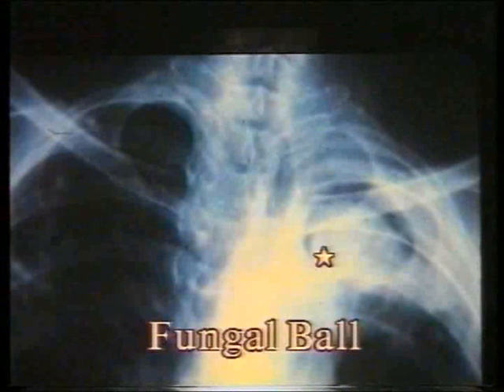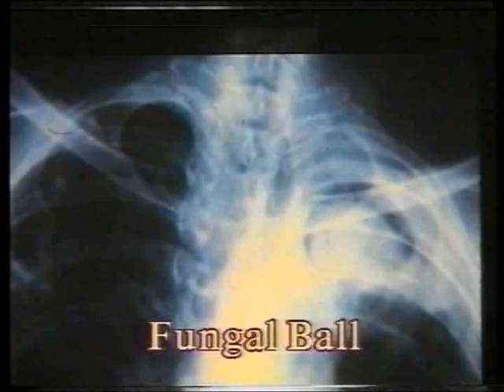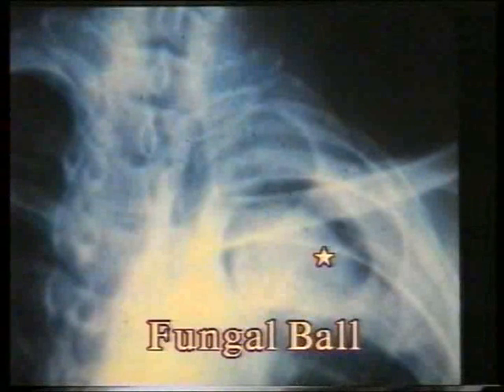Sometimes a typical tuberculous cavity shows a rounded opacity within it. Note this opacity in the left upper zone cavity. It is rounded and lying freely mobile within the cavity. This is a fungal ball. It is caused by superadded fungal infection, usually aspergillosis. Note the fungal ball within the tuberculous cavity.